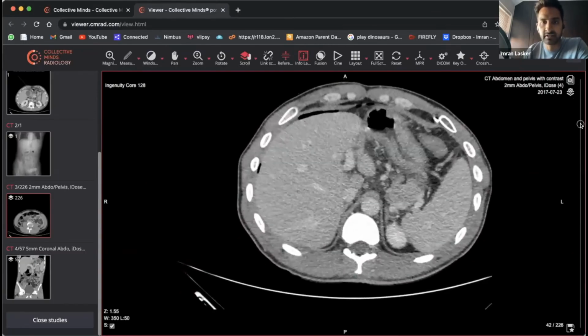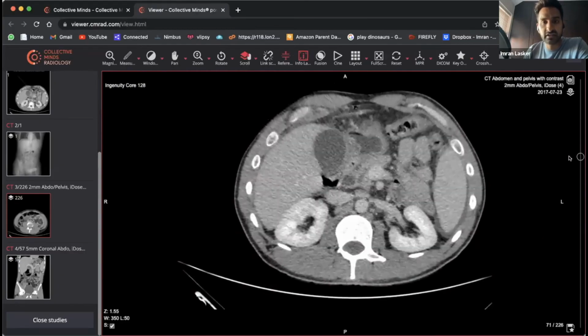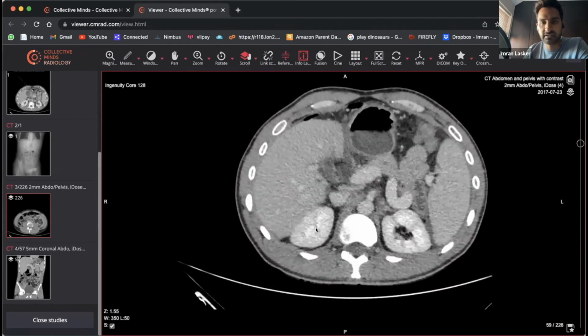Something's burst, right? So first of all, what phase of imaging? We've got the artery versus the portovenous system. The portovenous system looks slightly brighter, so this is a portovenous image. Scrolling through, the liver looks okay. The gallbladder looks all right, actually, doesn't it? And then we look at the kidneys, which are sitting here and here.